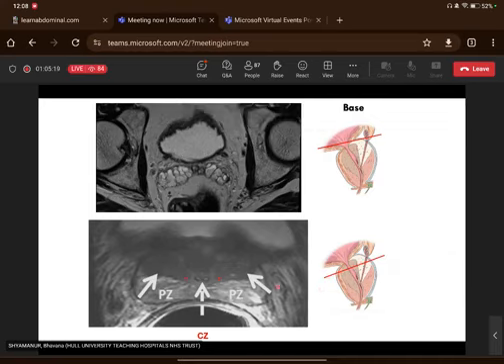At this level, you can see both of the ejaculatory ducts. And as I said, this area that's starred around the ejaculatory ducts is the central zone. That's often seen as a symmetric central dark area. Peripherally, you have the transition zone, and then these brighter areas here are the peripheral zones. On T2 at least, the transition zone is darker, and the peripheral zone is brighter. On T1, there's not as much differentiation between them. They're all quite low in intensity, so it's unlikely that you'd get a T1 image to differentiate the two.